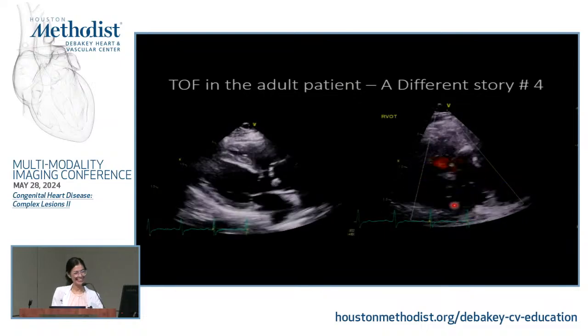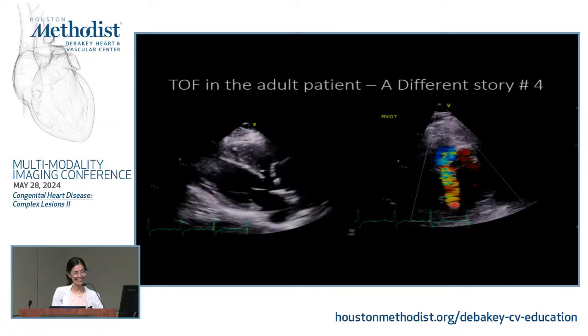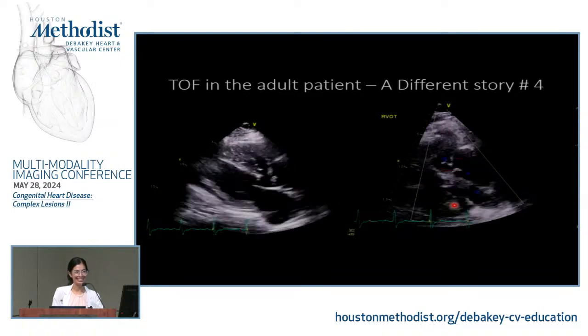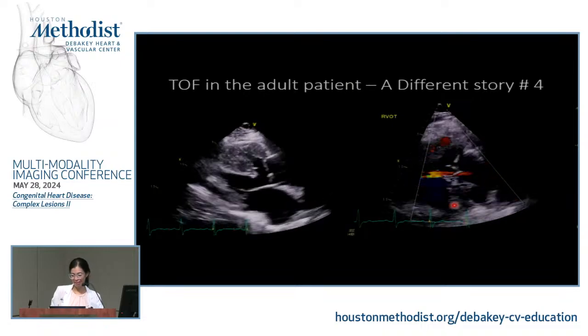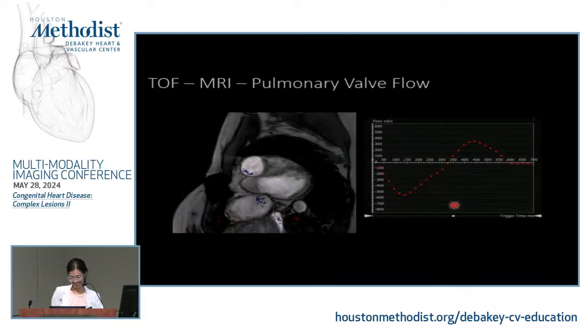The person who scanned the patient was doing an intermediate view and got this view of the RVOT that was the best. But it's an intermediate view. To the right, the aorta is to the right in that view. Yes. Sorry, to the left. And remember that the anatomy is also different. Yes. But this is the only pre-repair echo that we have for this patient, so that's what I'm showing.